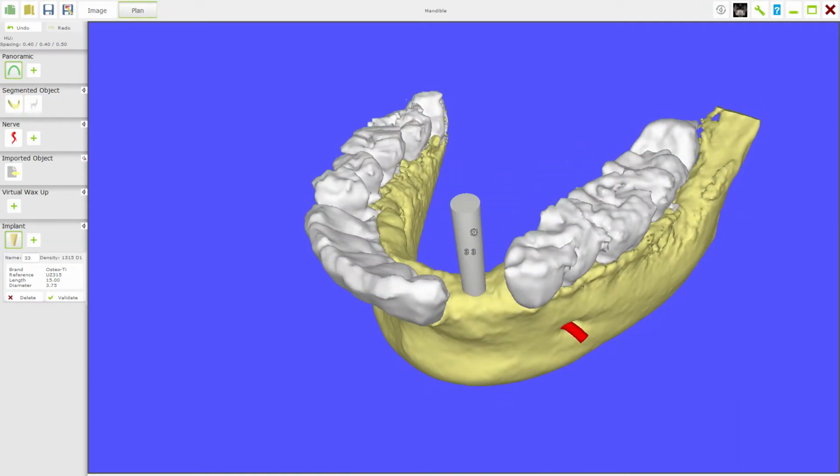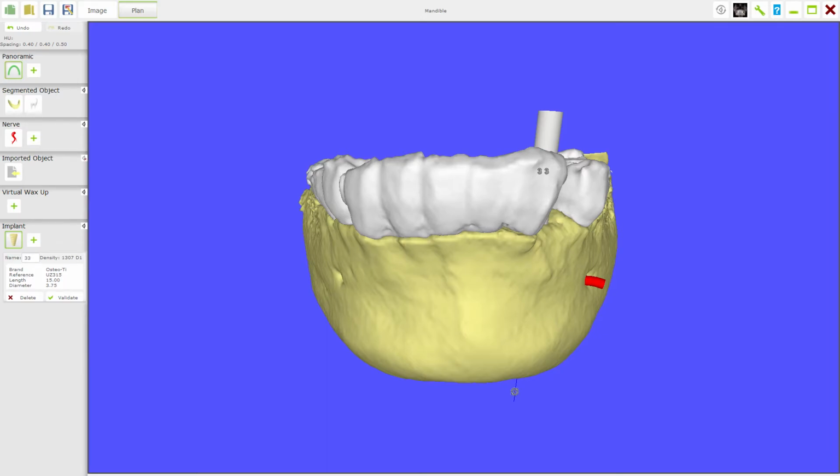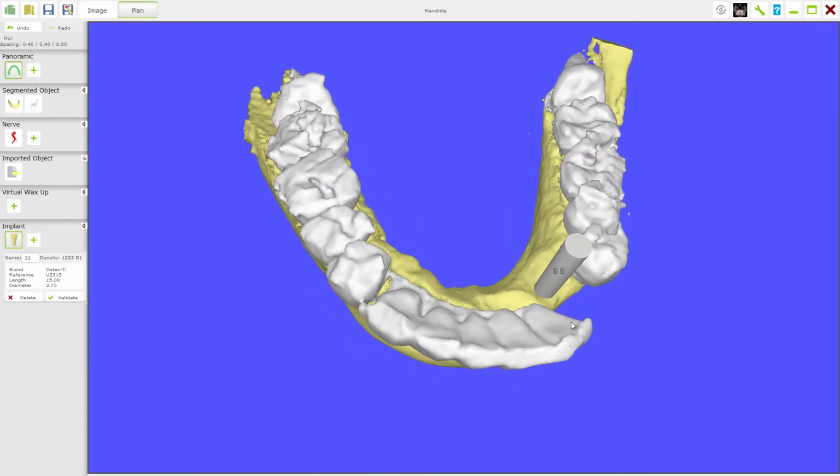Remember, if you position your handpiece just a few degrees out like that or like that, the implant will still integrate, but you will have a restorative problem on your hands. Again, you could have it a few degrees out, not just mesiodistally, but a few degrees out buccolingually, and now the implant head has really moved towards the lingual, and it's going to cause you a restorative issue.